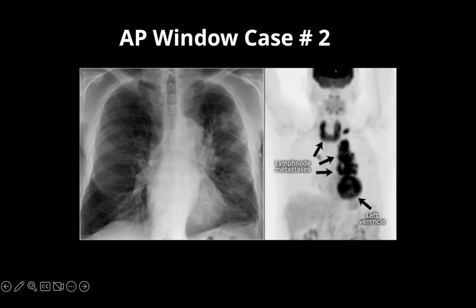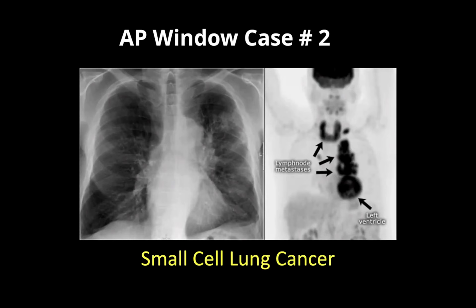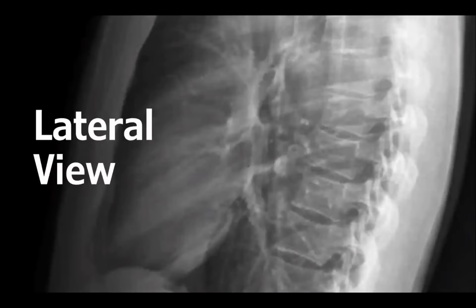That's the normal uptake in the brain and heart on PET CT. And there was also a case of a small cell lung cancer. Don't be surprised in cases of small cell lung cancer, because sometimes they are central tumors. They are presenting as a hilar and mediastinal lymphadenopathy, that is merging with the perihilar and hilar region with no discrete, separate lung primary. That is one of the presentations of a small cell lung cancer.